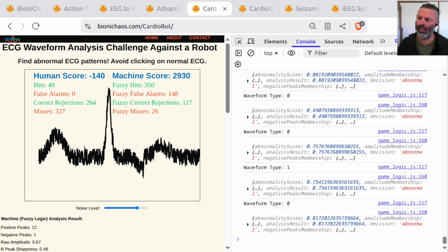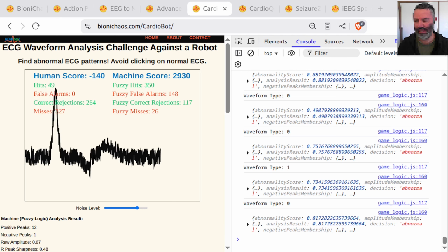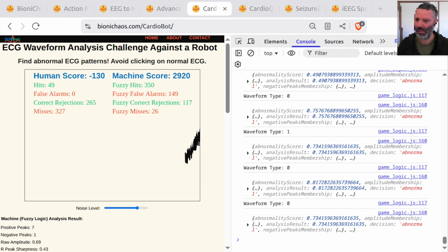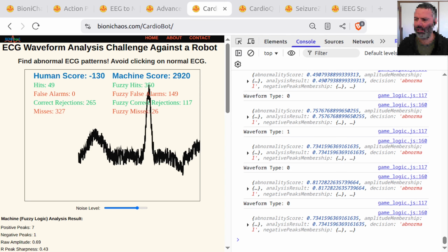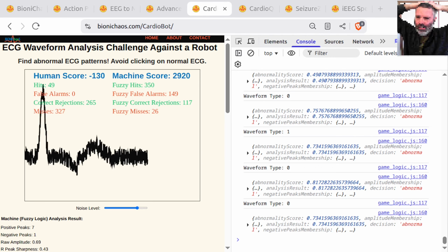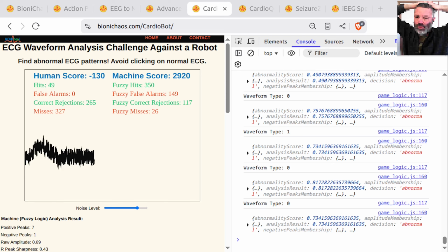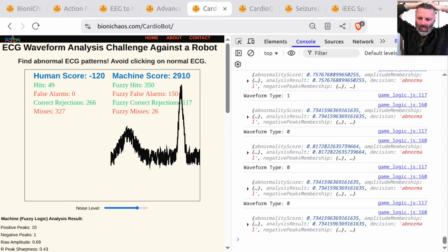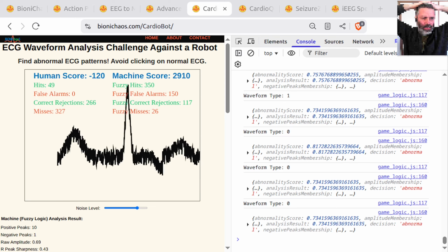Surely I will need to devise an algorithm for this. Okay. So I'll have some custom stuff. So the self-contained fuzzy logic implementation, while I've found libraries, the constraint of using only vanilla JavaScript means I will likely need to implement this simplified fuzzy logic system from scratch. I actually prefer that.